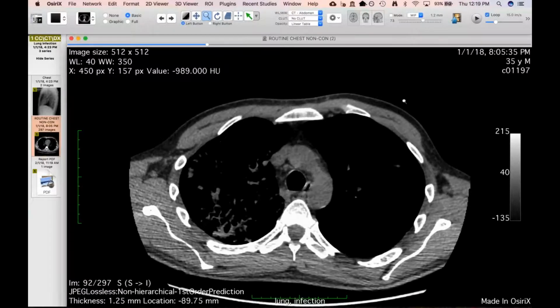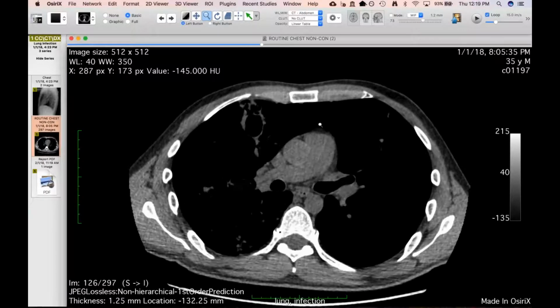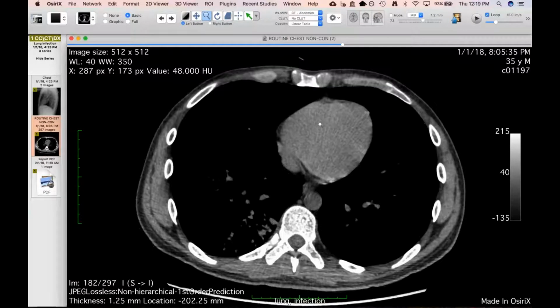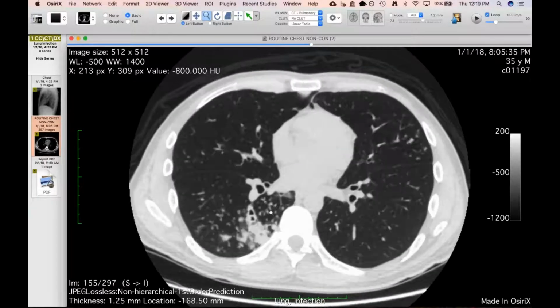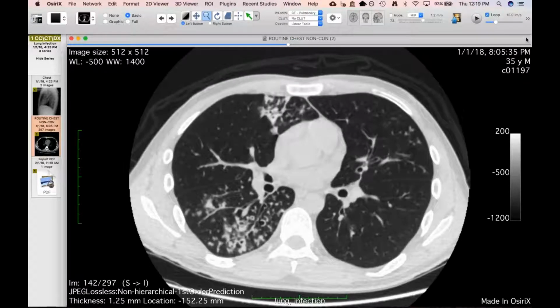I don't see any here, but it's interesting. Do they have pleural disease when you see that? Some with, some without, so it's just something we've been looking for recently. But no, I don't see any. The take-home message here is don't forget about TB when this person comes into your emergency department. All right, Howard, I'll stop there and let's swing back around if necessary.